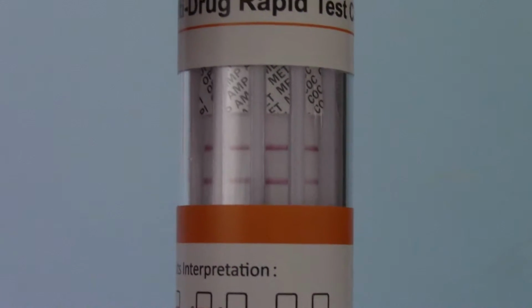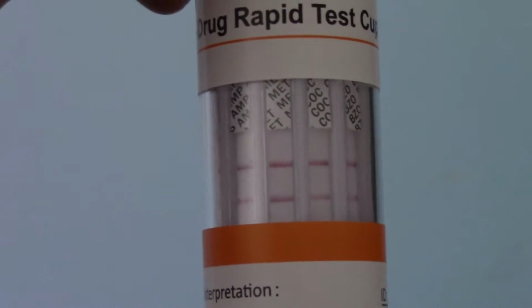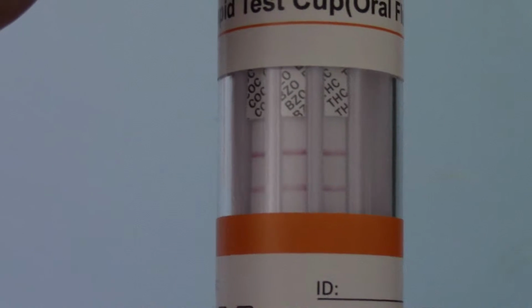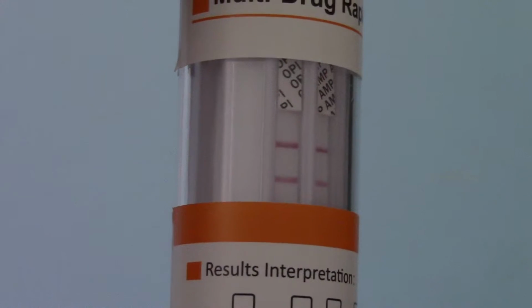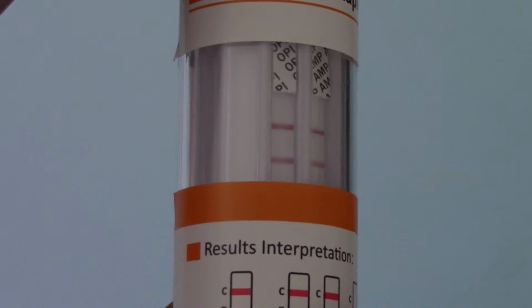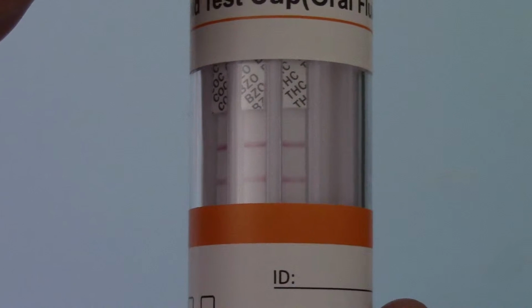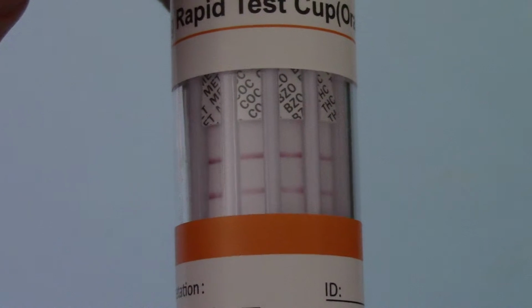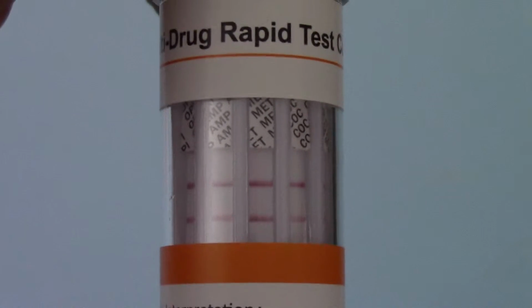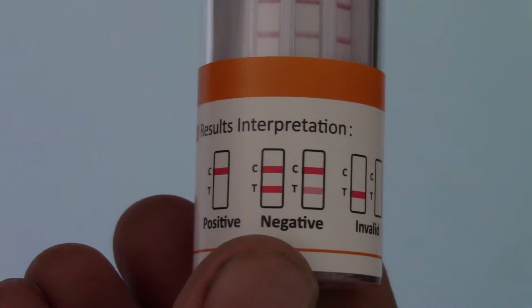These all screen to different cutoff sensitivities, and you will see some variance even between different samples, but certainly on different test membranes when you compare these control lines and the test lines. And you must always interpret a very faint, very thin or even partial test line as a negative result. If you are in doubt, repeat the test, but the thickness of that test line does not have any bearing with regard to a test being just positive or faintly negative. These are cut-off tests. You must interpret the results as positive or negative using this guide.